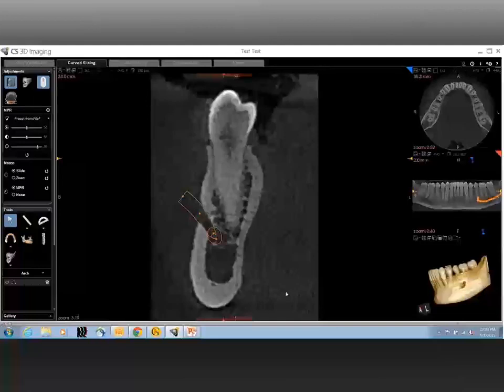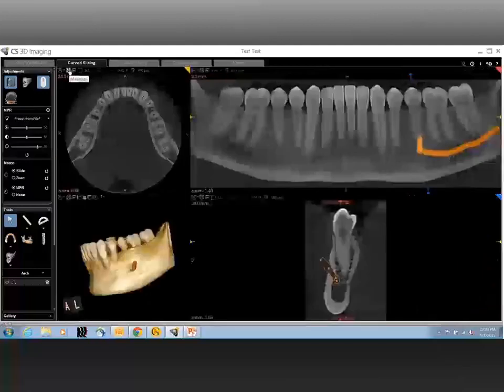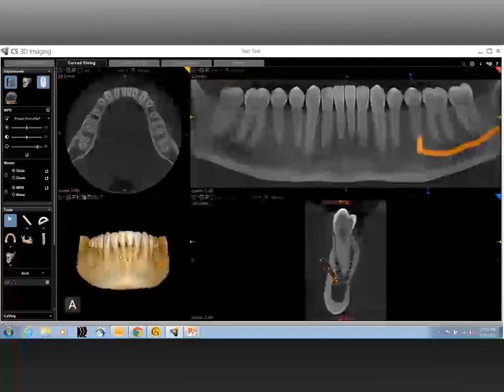Excellent. Well, this is very helpful. I really appreciate your time, and I know that those who will watch this in the future are really going to benefit from your opinion, your candor, and the time you spent showing us how to do an anatomical review of the mandible. I do want to restate that this was a cursory overview, not a complete overview of the scan, not a read, but a very quick overview to give us a good idea of the important structures, when to look at which structures, how to focus in on those specific to a task, and what to do in terms of recording findings, that it is imperative to place those into the chart.